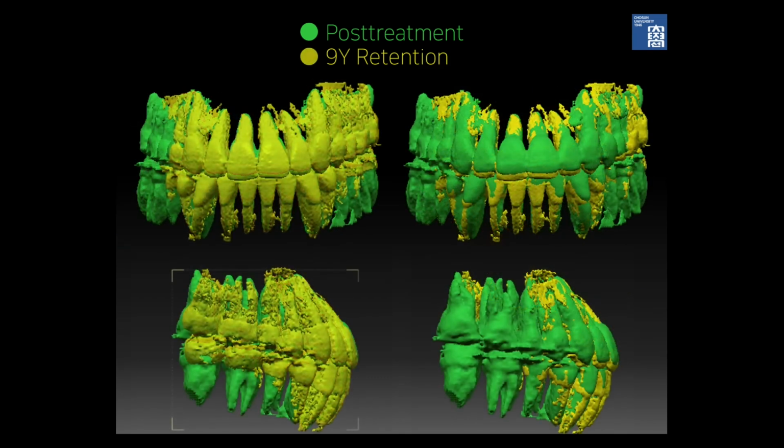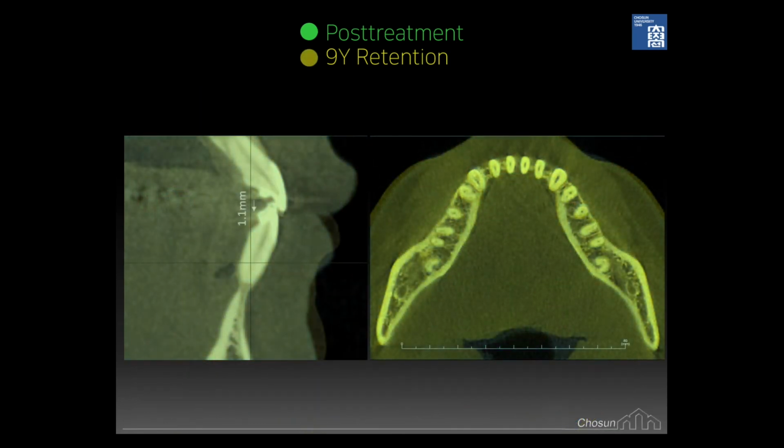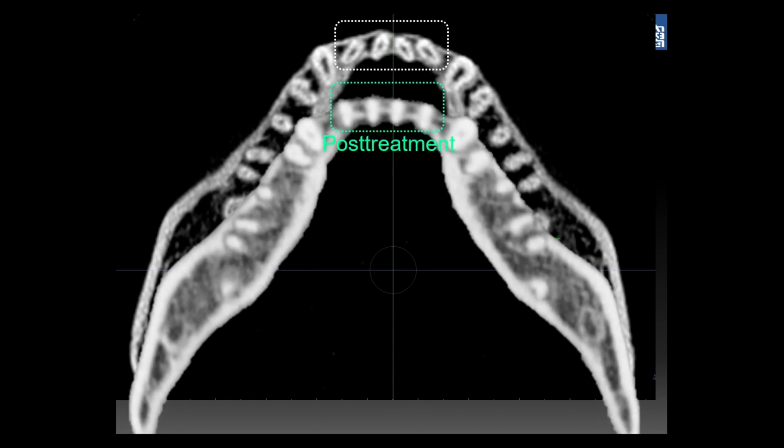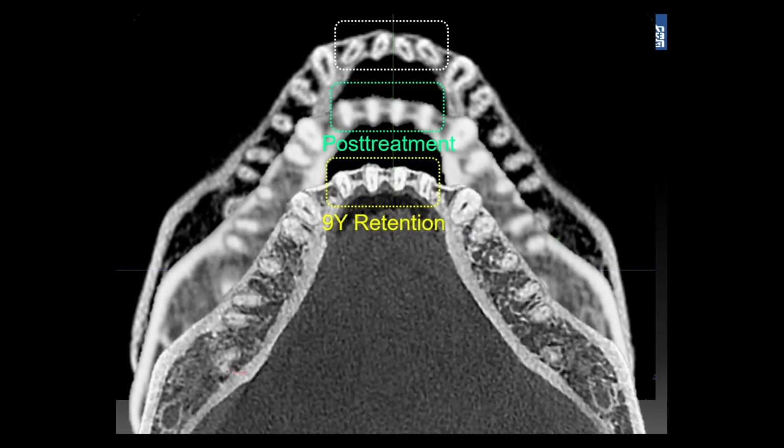Mandibular incisors were intruded spontaneously and the maxillary incisors erupted accordingly, improving the exposure of the maxillary incisors. Although the mandibular incisors were intruded spontaneously during retention, the alveolar bone was not thickened. Initially, there was mild washboard-shaped alveolar bone scalloping at the incisor region, and this was exacerbated during treatment due to extrusion of incisors. This was not improved during 9 years of retention.